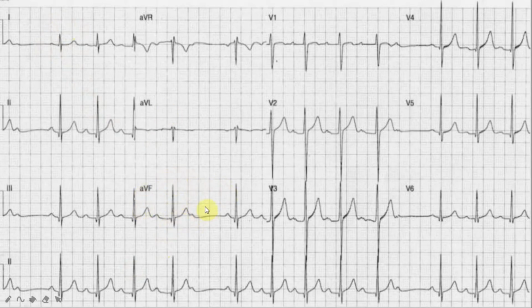The P wave is normal and the PR interval progressively prolongs, followed by intermittent non-conducted P waves. Just like the previous ECG, in this ECG too, we have 4 QRS complexes for every 5 P waves. Therefore, there is a 5:4 Mobitz type 1 second-degree heart block. The QRS complexes are narrow complex and regularly irregular.